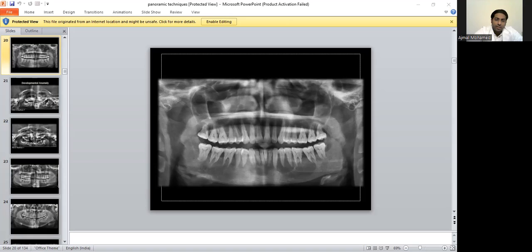The follicular size is more than 2 to 3 mm, and here also we diagnose this as a dentigerous cyst, a unilocular radiolucency encircling an impacted tooth. Surgical excision of this cyst has been done on both sides, along with removal of the impacted tooth, and the biopsy report came as dentigerous cyst.